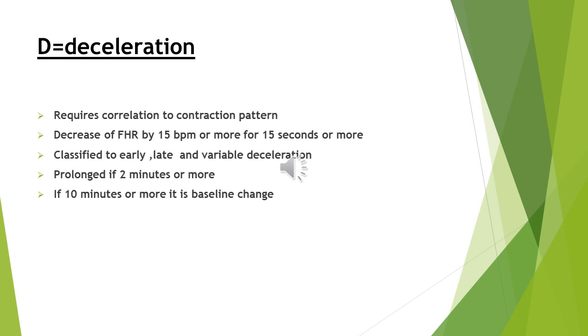Deceleration is the opposite of acceleration. So it is a decrease in fetal heart rate by 15 beats per minute for more than 15 seconds. And depending on the correlation with the contraction, it can be early, late, or variable. And it's prolonged if more than 2 minutes. And if it's 10 minutes or more, it actually changes the baseline.